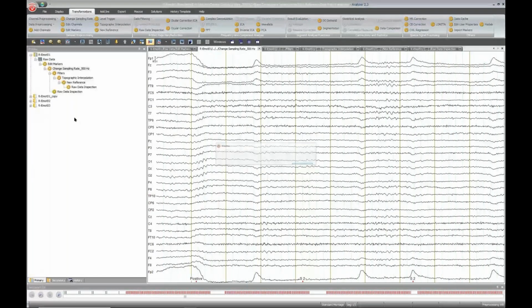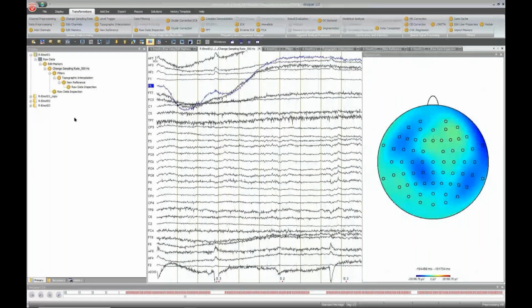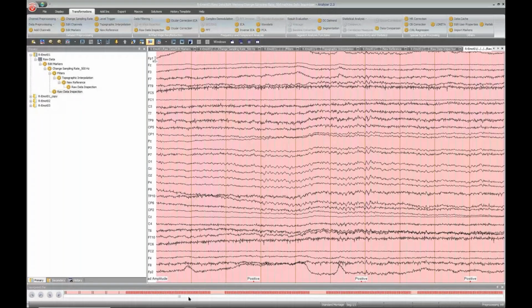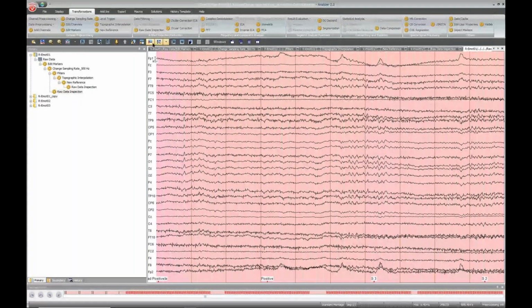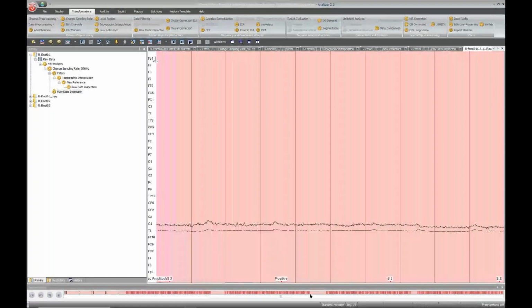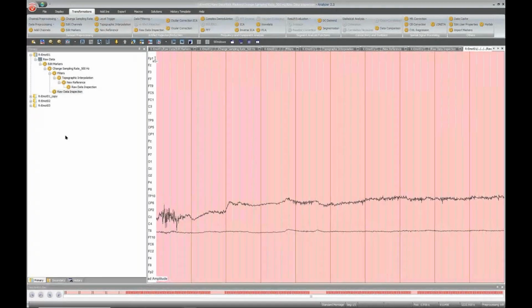And I will activate the output. And you can see that now everything is marked as an artifact, because if you remember, if I deactivate the centering function here, the channels have very large offsets, so that means that the entire time they are above our artifact criterion. So everything is an artifact now. And for that reason, since I wanted to use this amplitude criterion, then I only did it after filtering.